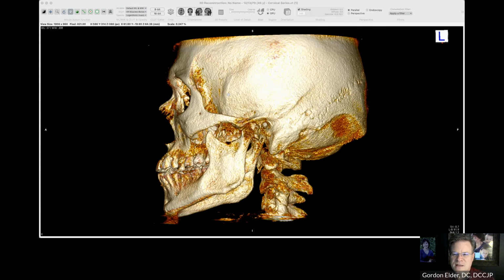The second thing is that this is not a pathology tutorial. Obviously, if you're going to do cone beam analysis, you need to have a report, whether you send it off to a radiologist or not. Now I have two reports. I send it off to a radiologist and I get the path report back. It tells me about the lordosis, where all the osteophytes are, and if there's anything worse. But I also have my own report. When it comes to pathology, it's what I'm seeing, but I'm not too worried because I know I'm going to get the radiologist report. I'll see things a little differently than the radiologist, but between the two of us, we get everything covered.